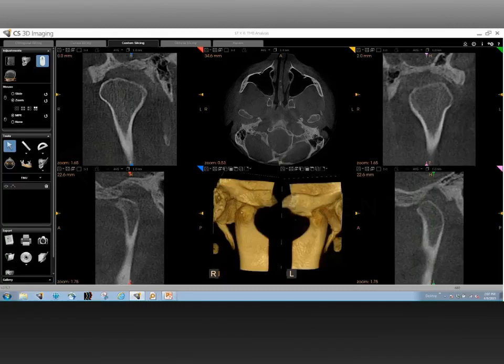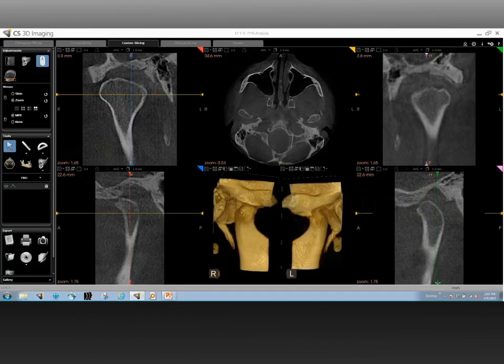You see the first change over here. You notice some sort of flattening. In fact, you can see on the lateral side, you can see on the superior head, there's actually quite a bit of loss of cortical bone there. And then as we go further lateral, you can see a remarkable indentation indicating possibly a very chronic degenerative disease, osteoarthritic disease on that side.